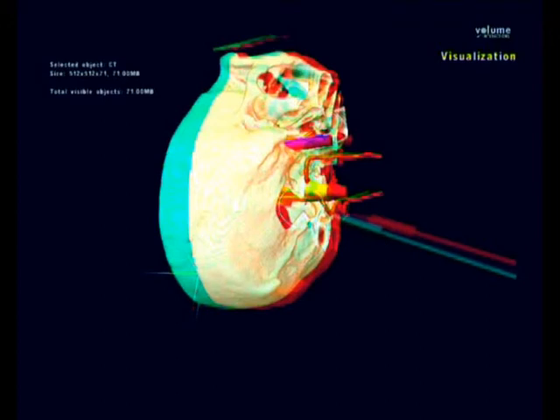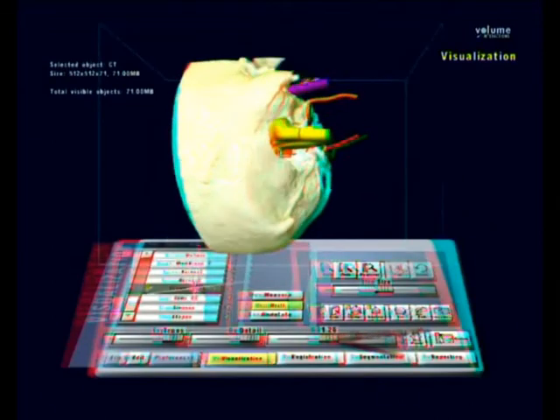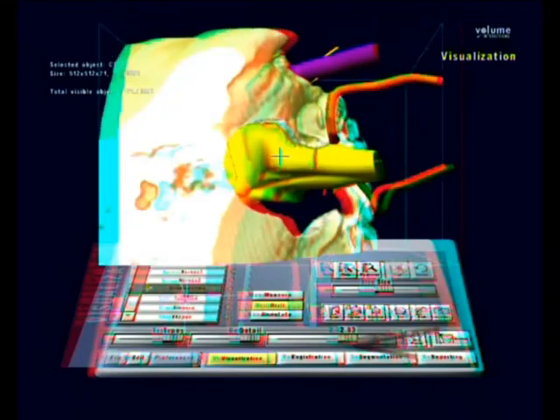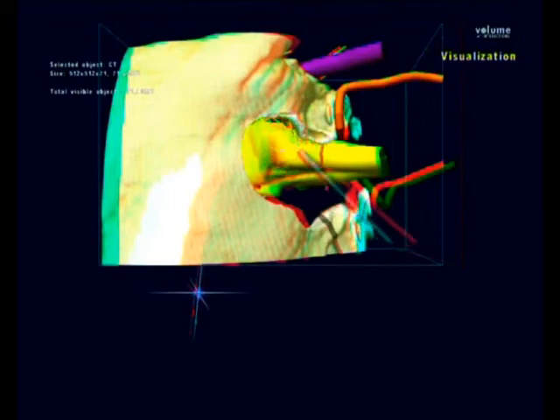In the transcondylar approaches used to expose the anterior cervical-medullary junction, a lower craniotomy is performed, which incorporates removal of the lip of the foramen magnum. The vertebral artery is exposed from its extracranial to its intracranial course as it winds around the occipital condyle.